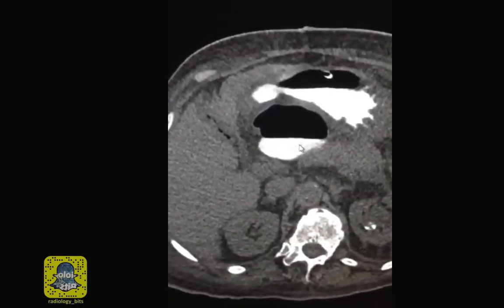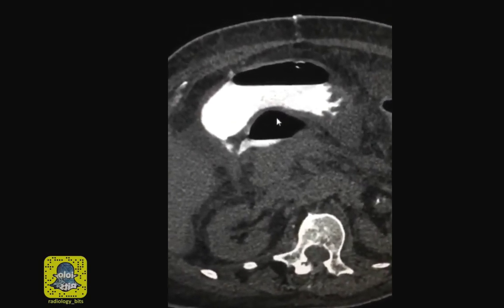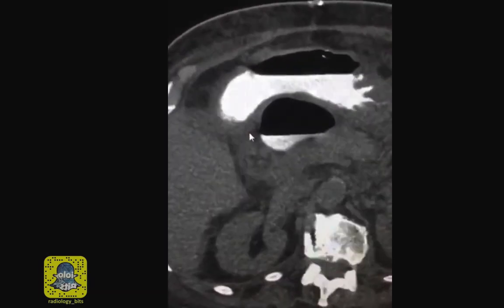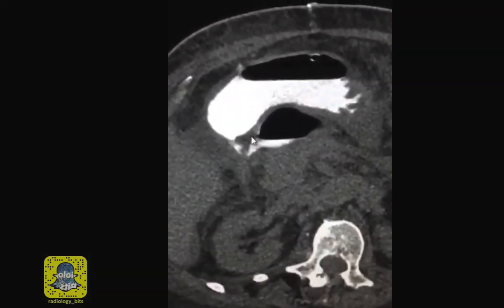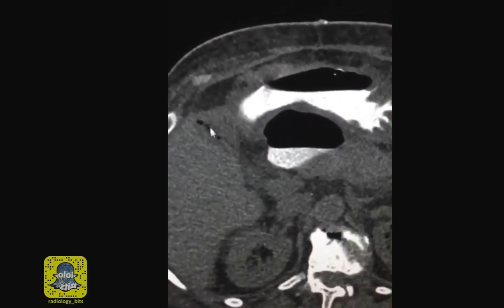behind the stomach here. It's not surprising to have perforations with localized collections and absent large amount of free air. So don't expect a large amount of free air with all of these perforations. However, have you noticed the small amount that's localized here?